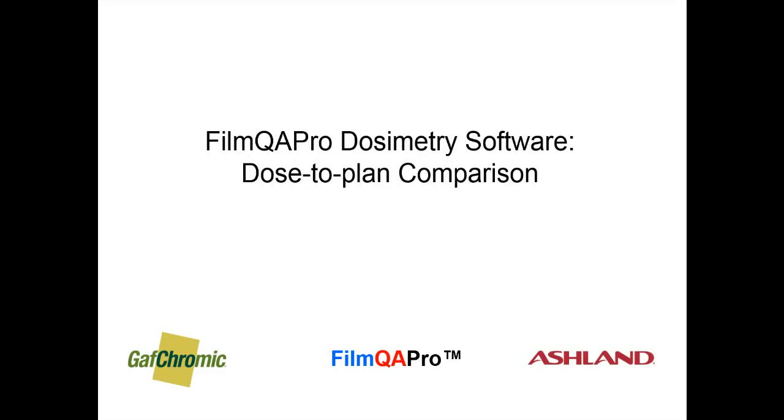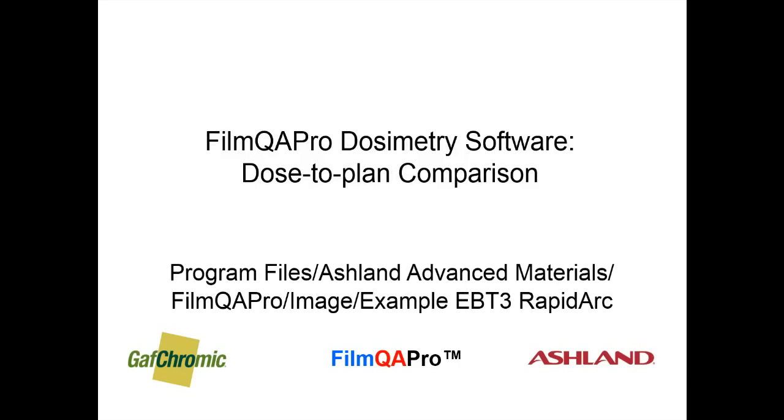In this tutorial, we're going to compare dose measurements on film with a patient-specific treatment plan. I'm going to assume you've completed film calibration and generated a dose map, and you're going to continue to use the EBT3 Rapid Arc example included in the Film QA Pro installation package. The route is shown at the bottom of the screen.